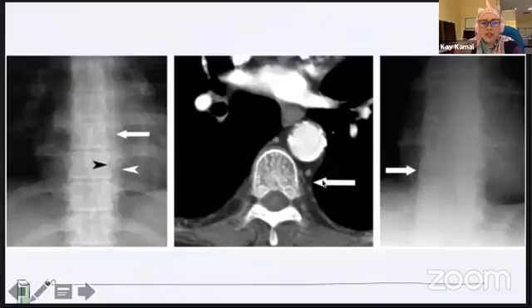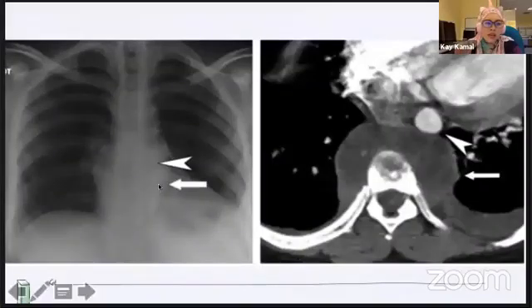So this is how it is seen in the X-ray. In the CT scan, to translate back to this X-ray, this is the normal line. But if you see here, suddenly it becomes fat like that, whereas this is our usual aorta. How come it became fat like that?